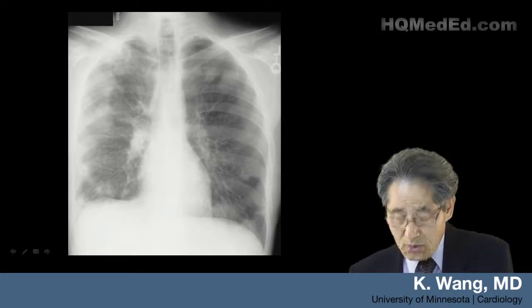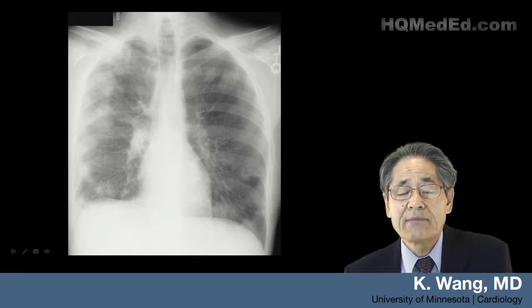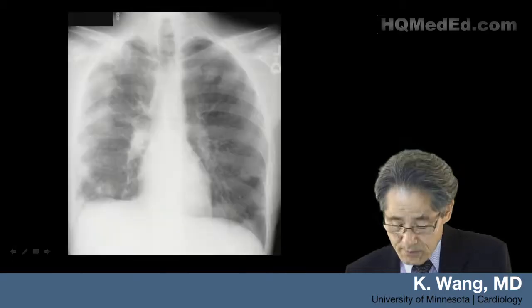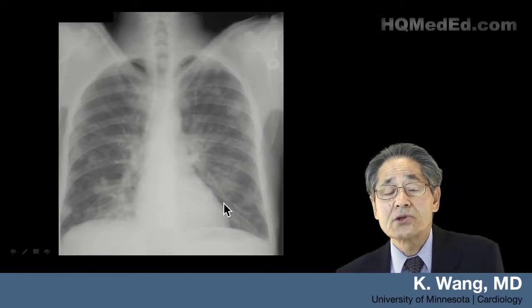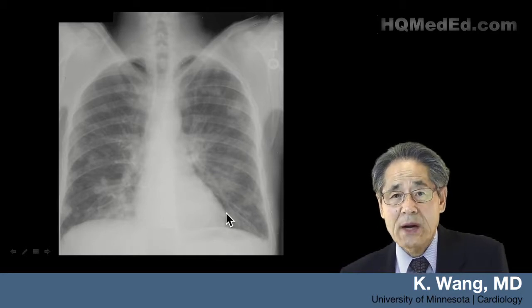So when you see these multiple nodules which tend to cavitate, like here or here, this is diagnostic of right-sided infective endocarditis.